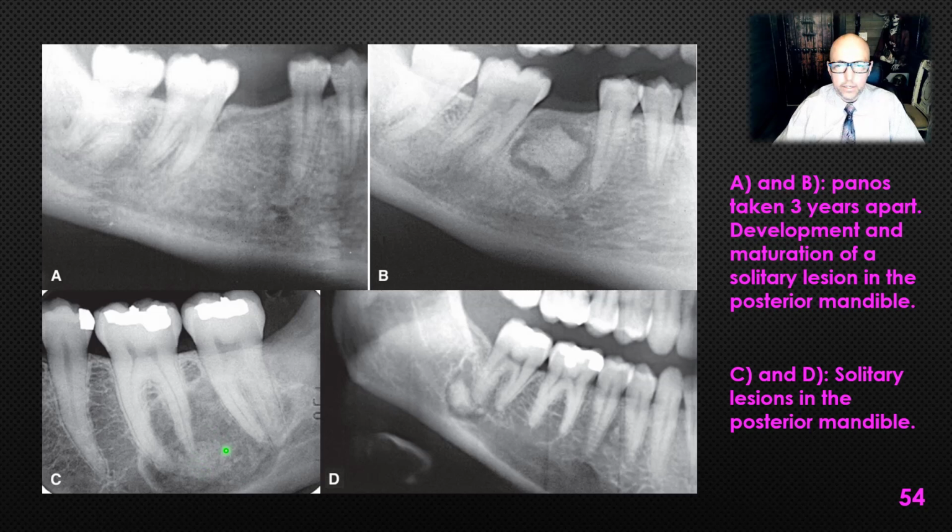Here we see more of that granular, cloudy appearance, mixed lesion, but the lucency does what? It goes all the way around that calcification. I don't see lucency just localized to the apices of the tooth, which I would expect to see with an inflammatory lesion. This one again, lucency around the outside of it, kind of a cloudy, amorphous, calcific mass internally, very typical of cemento-osseous dysplasia. So what did I say we call these ones that are localized to one area outside of the anterior mandible? This is a focal lesion. All of these are focal cemento-osseous dysplasia.